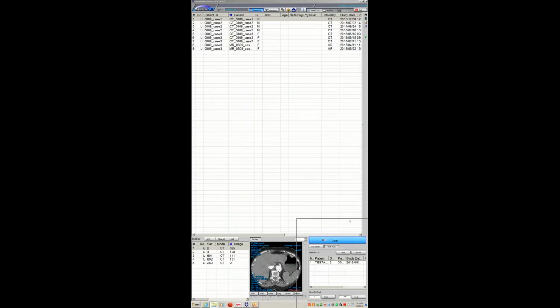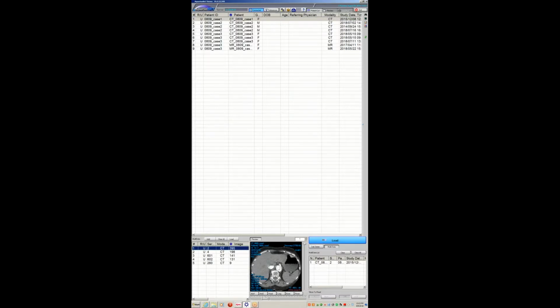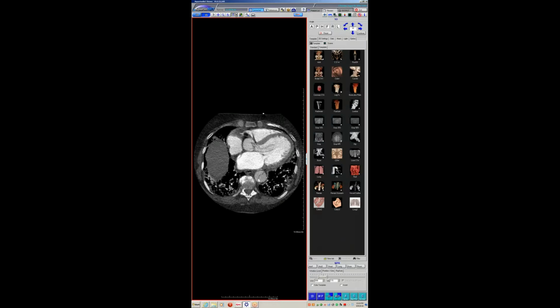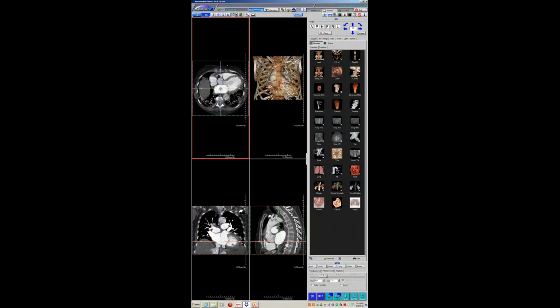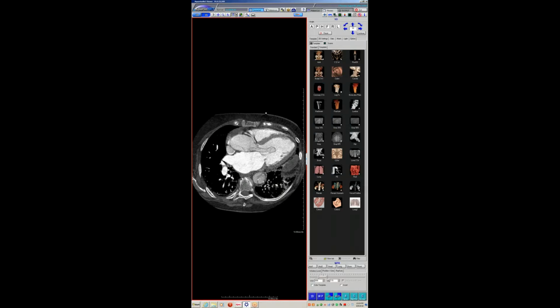And so this is a case that Sharon showed me the other day, and I had shown a case. I know Travis, or you guys probably all like this, where this patient had a type A dissection. What was interesting is you can see that there was an aortic dissection with the intima actually displacing into the left ventricle, forming this kind of windsock deformity sitting here. Can you guys see that? Lovely, yeah. And then, so we have some echo images where you can actually see this thing.